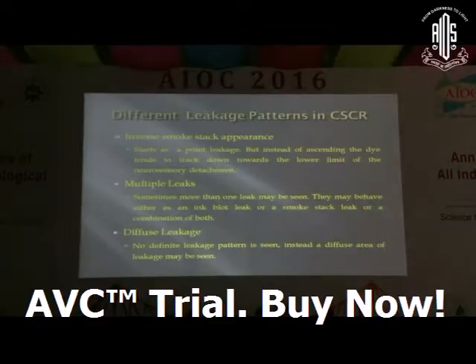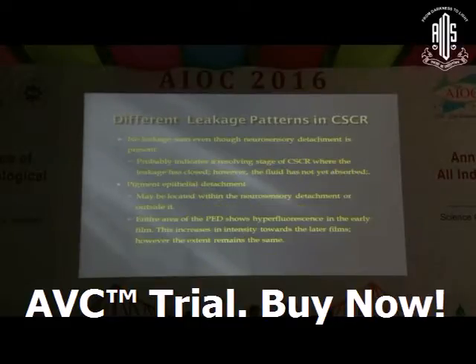Diffuse leak is the next pattern. No definite leakage pattern is seen. Instead, a diffuse area of leakage is seen. In some cases, you will find no leakage, though CSR is present. So probably this indicates a resolving stage of the CSR where the leakage has closed, however the fluid has not yet been absorbed.